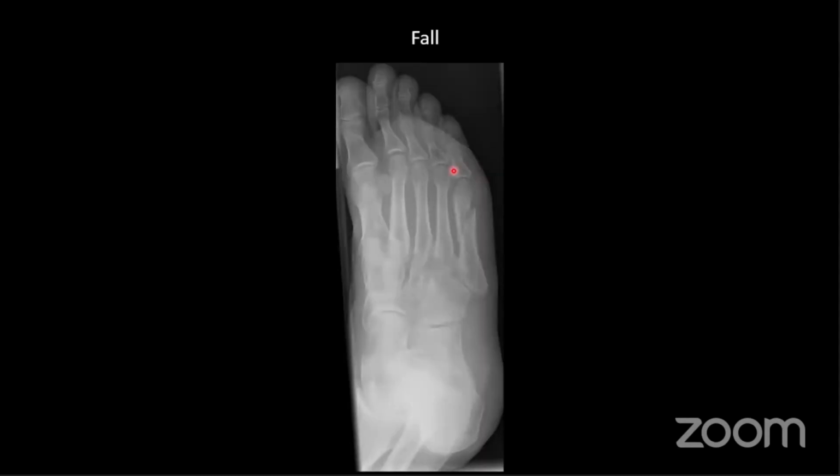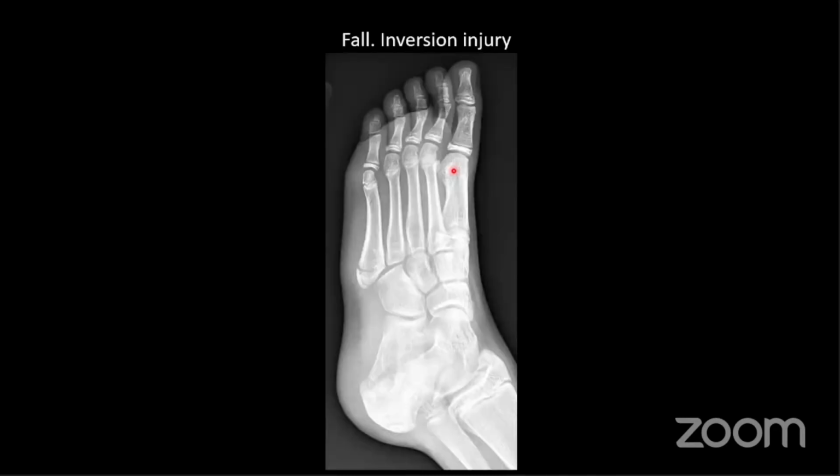Right, okay, so this is probably also quite easy. What's the abnormality here? Yep, very good. What about this one? If I'd known you guys would know the answers to all of these, I would have made some of these harder.